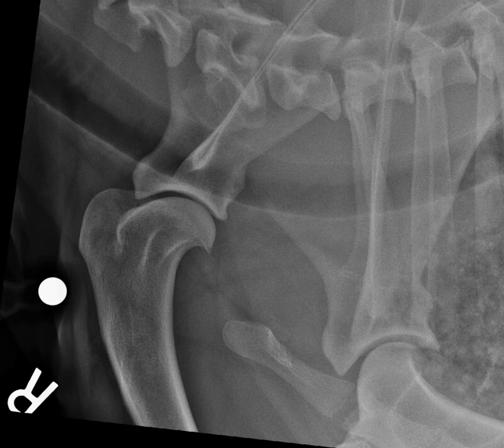We've been working on orthopedic cases for the past several sessions, so you know to follow a systematic approach using your ABCDs to trace each bone on each view. In this patient, we have one more step to consider, but let's start with our orthopedic findings first.